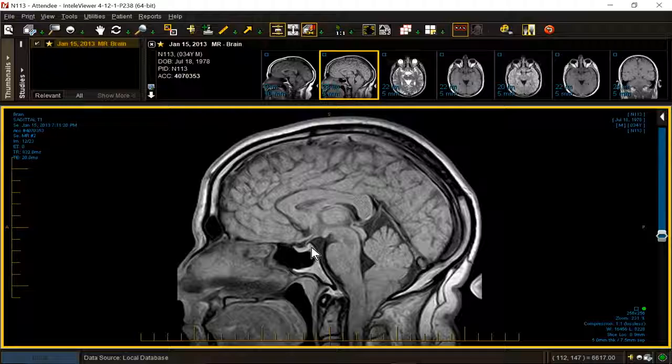Otherwise, stay with tonsillar ectopia. The amount of tonsillar descent is far less relevant than you were initially led to believe in the beginning of neuro-MRI. And this approach has been gaining tremendous steam over the last decade.